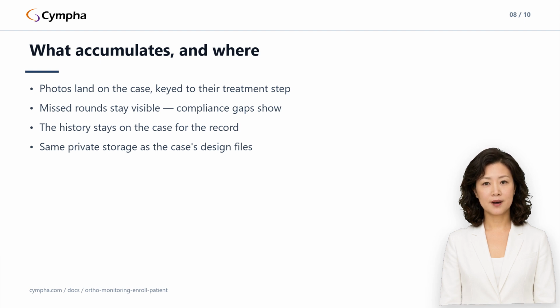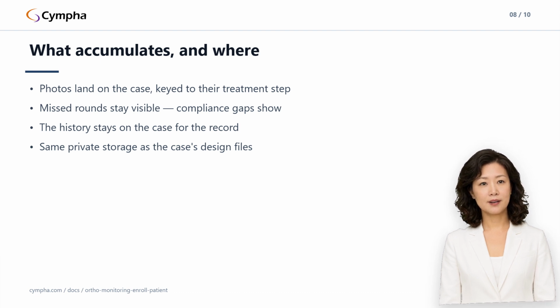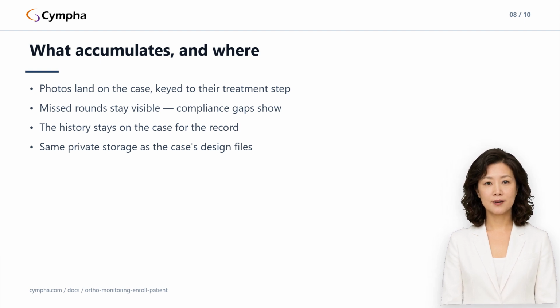On privacy, the boundaries are firm. Every photo lives inside the patient's case in your Cympha account, the same private storage that holds the case's design files, and the patient role provisioned at first sign-in has no access to other patients, no access to colleague cases, and nothing beyond the specific plan you shared.